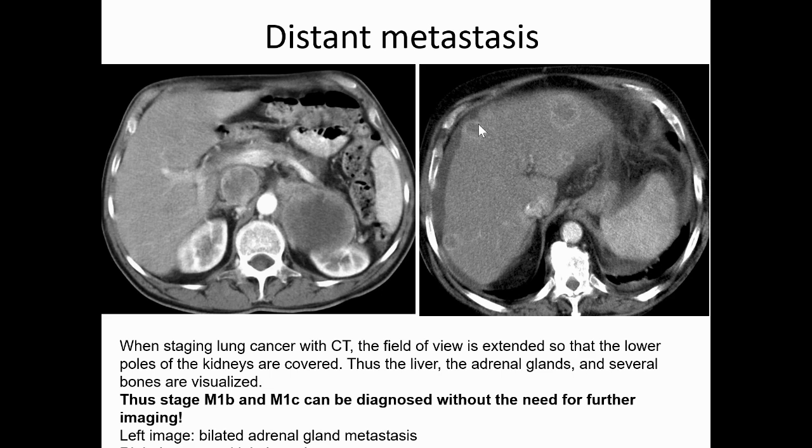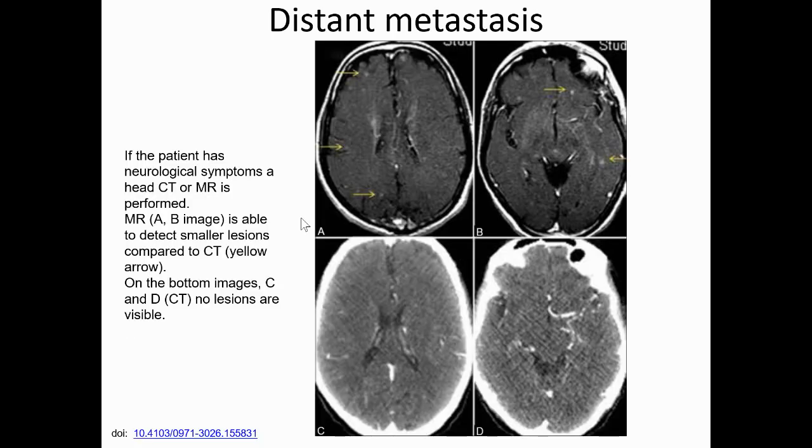These are metastases. There is effusion, free fluid in the abdominal cavity next to the liver. That's also not a good sign. And on the left-sided image, if you look, the left kidney is displaced by this large, heterogeneous, mostly hypodense lesion, which is suprarenal gland metastases.